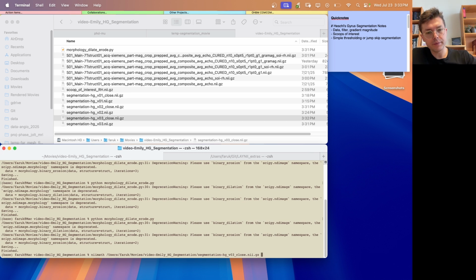Put the data in. Then I will activate the Gaussian smoothing operation. It takes full width half maximum as the second parameter, and our voxel resolution is at 0.175. It doesn't matter so much, but roughly your minimum full width half max should be your voxel resolution. Since we are doing fine work, I'm going to just put it at 0.5 millimeter resolution, so it will smooth the data. And once it is smoothed, every value will become a value between 0 and 1, because we had a binary image of zeros and ones.